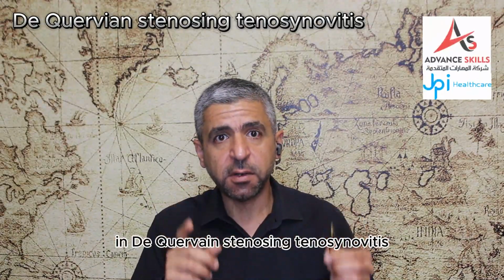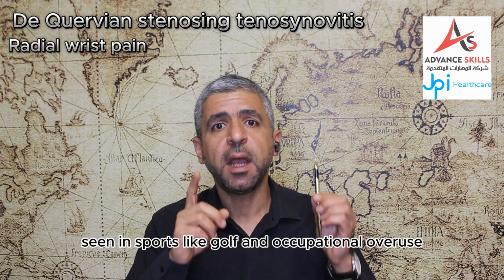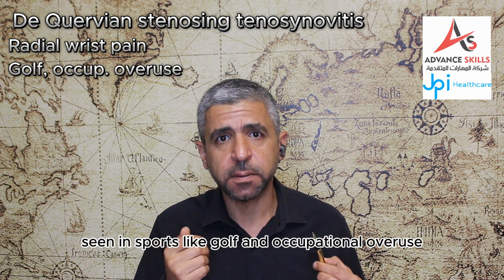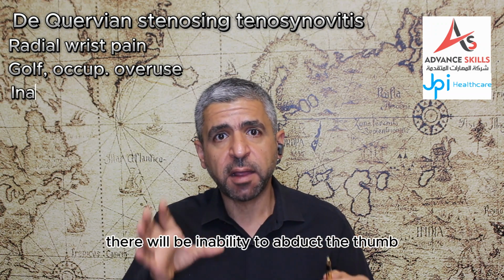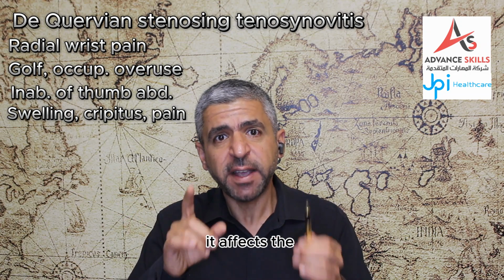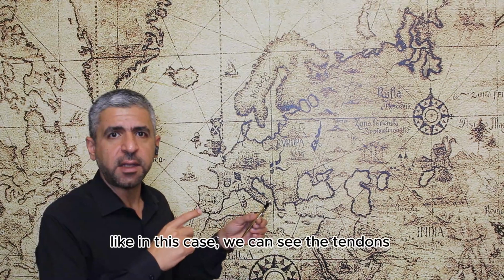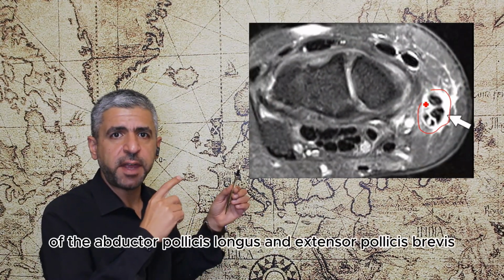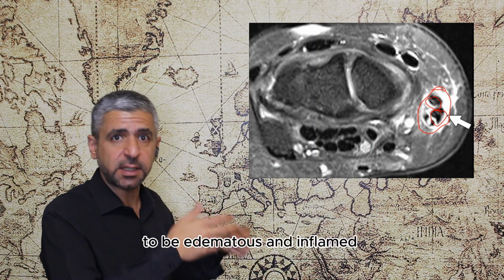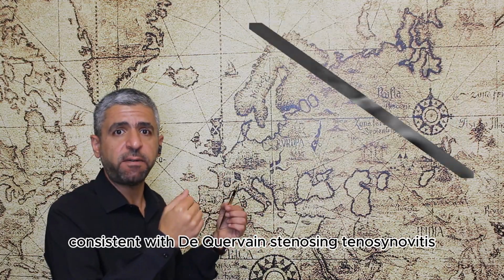In de Quervain stenosing tenosynovitis, there will be radial-sided wrist pain seen in sports like golf and occupational overuse. There will be inability to abduct the thumb, radial-sided swelling, crepitus, and pain. It affects the abductor pollicis longus and extensor pollicis brevis. Like in this case, we can see the tendons of the abductor pollicis longus and extensor pollicis brevis to be edematous and inflamed, consistent with de Quervain stenosing tenosynovitis.